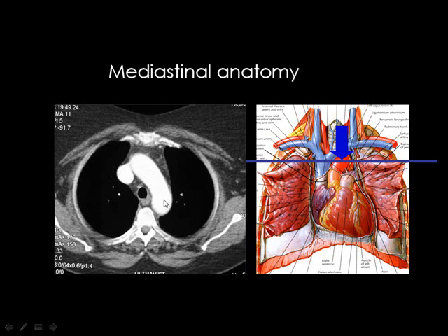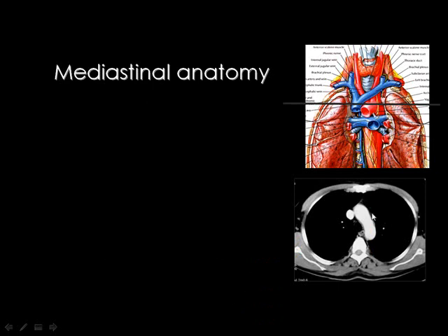interpreting the CT scan of the chest, you should put your finger first on the arch of the aorta. Then you know, adjacent to the arch of the aorta, nothing but the superior vena cava. And this is the anatomy here. The trachea and the esophagus will be examined in the lung window because they usually contain air. Then if you see the banana or the arch of the aorta and you identify the superior vena cava, what is the anatomy above and what is the anatomy below?